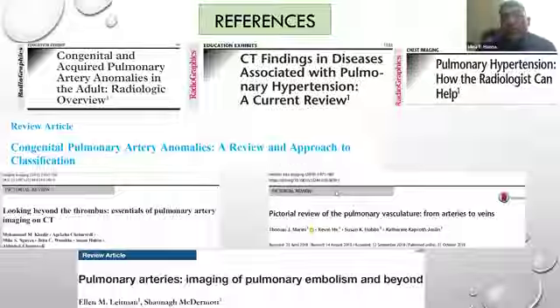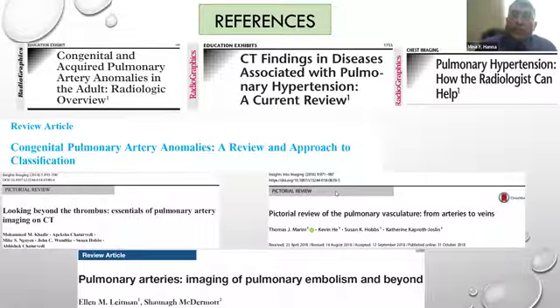The best way to differentiate is using high resolution CT. So we do regular inspiration and we do expiratory phase. In the expiratory phase, you will go to the lucent area. If this lucent area in the inspiration becomes more dense with expiration, this means there is no small airway disease. This is mainly vascular because the air which goes in goes out again.